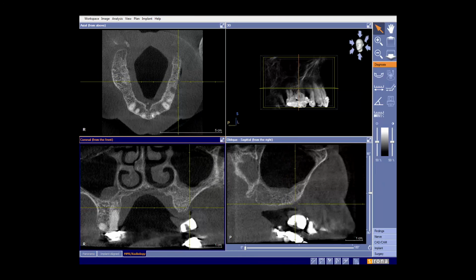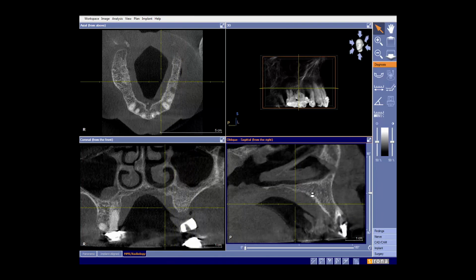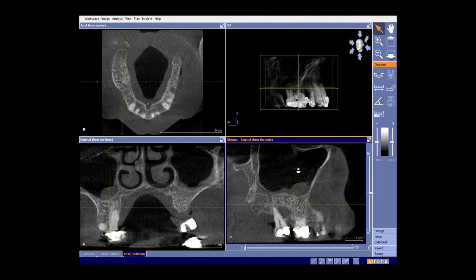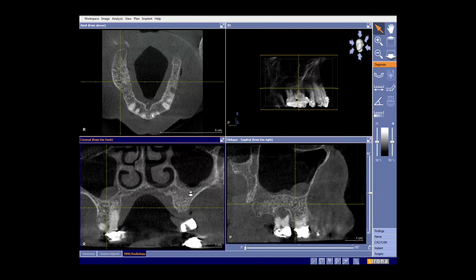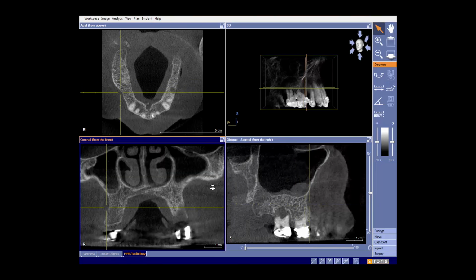On the upper right, you can see a thickening of the sinus membrane. In this case, I transfer to the sagittal section to tab through this to see the nature of the thickening and to report upon that. Doing this will also show me the anatomy of the internal aspects of the nose. Once I've viewed that and made my decisions on the pathological elements of that, I can tab through the whole of the MPR coronal view. It's an excellent way to view sinuses and inferior dental canals.